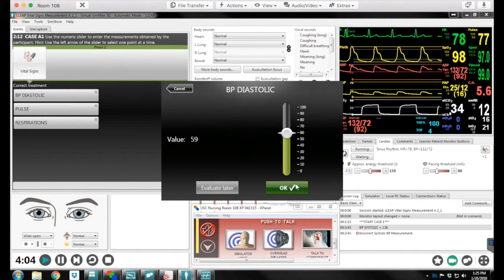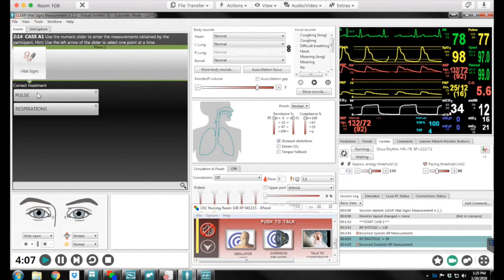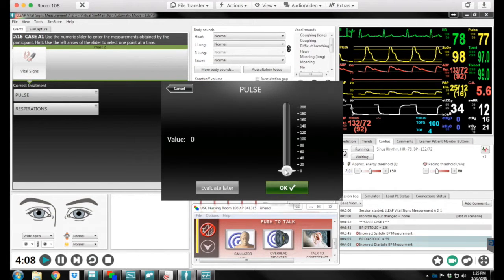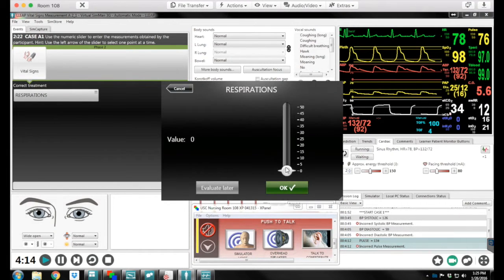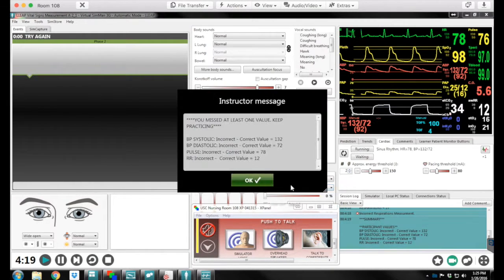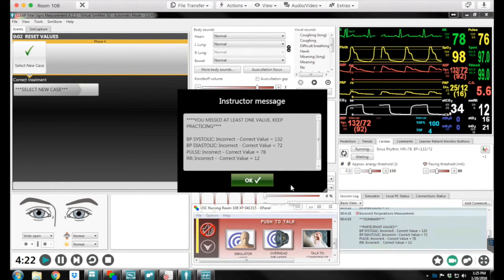All right, and I'm just guessing here. And then the pulse, same thing. Just dial it in, 134, and then respirations, same thing. Mark will be choosing these as she tells. Okay. All right. So then the instructor, the actual person running the program, will get some feedback.